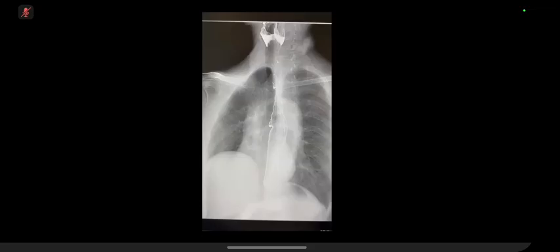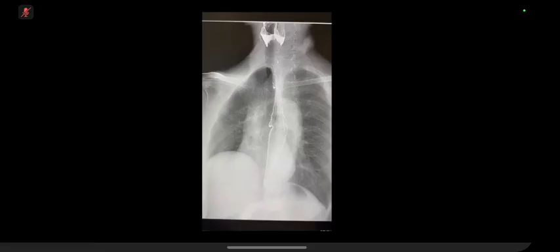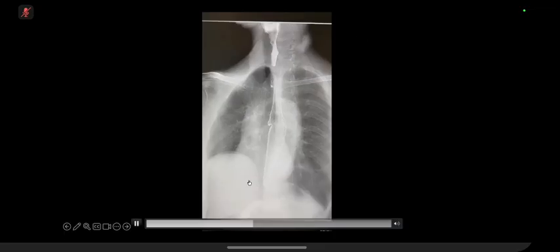So all your thinking was on the right track. You just needed to communicate your thought process. And always remember, you should always use logic when you are putting the differentials. If there is a focal indentation from outward to inward on the lumen, it will not cause an outpouching. It will appear as a filling defect, but eccentric and limited to a wall. But when you see an outpouching, that means the muscular wall in that area is becoming weak and collecting contrast. That's the definition of a diverticulum. Yes, ma'am. Let's move on.